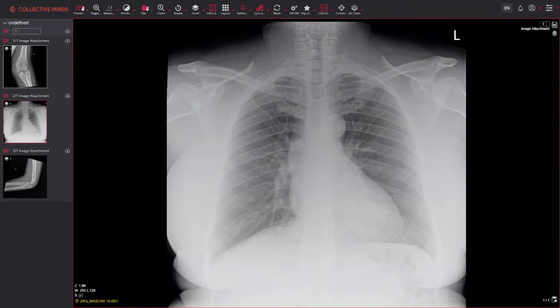It's termed cardiomegaly. Obviously, that only applies to PA chest X-ray, which is why it's important to look at the annotations. If it's an AP X-ray, we're getting over magnification of the heart, so it's very difficult to accurately assess the heart size. If it's over 60%, then it's still enlarged, in my view, regardless of whether it's an AP or not. But if it's between 50 and 60%, you can't accurately assess it. Obviously, if it's below 50% on AP or PA, then it's normal anyway.